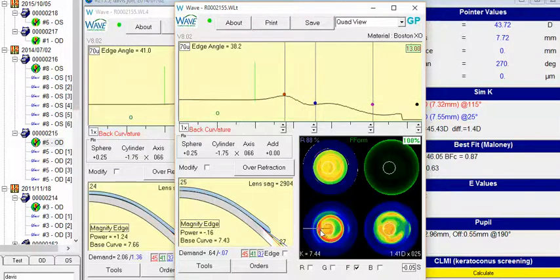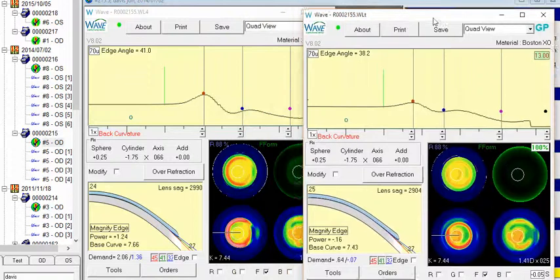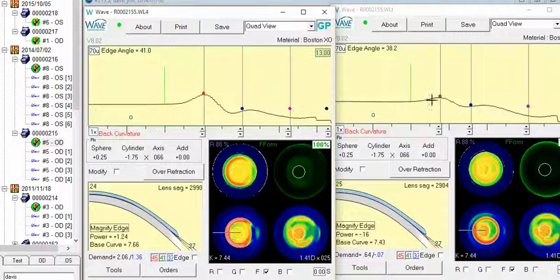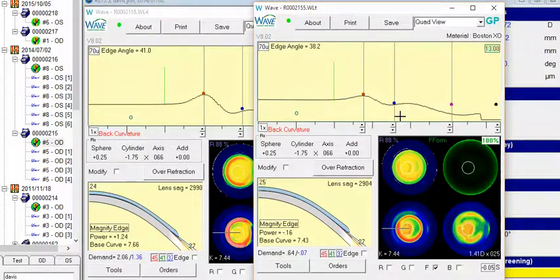now if we click down in the lower left in this 9 o'clock radial, we now have smoothed that out a little bit more. So you can see in your original design you have a little bit more of an abrupt zone there. This one's a little bit smoother, and I think working on that a little bit, you can clean that up a little bit more if you want.